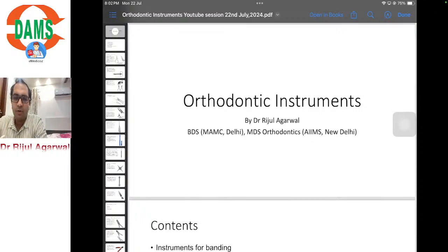So the topic for today is mostly going to be images only. In each exam, one or two, I won't say two, one image comes of an instrument identification from orthodontics. So I will be taking up that and summarizing that up.